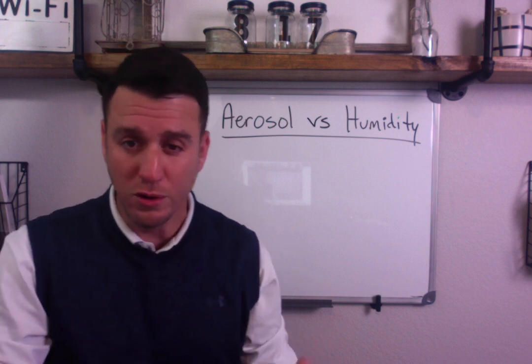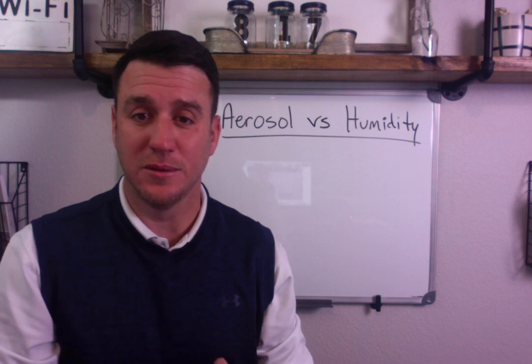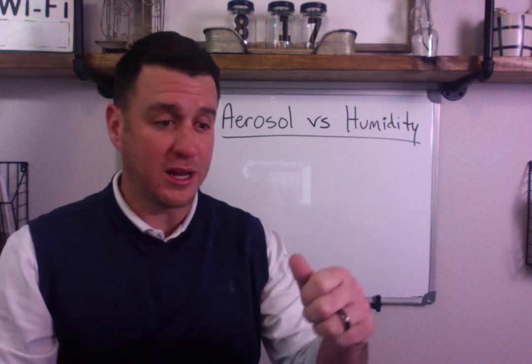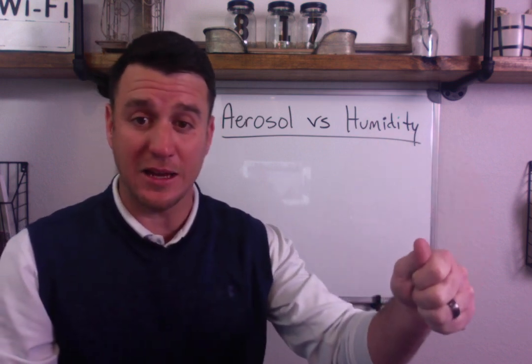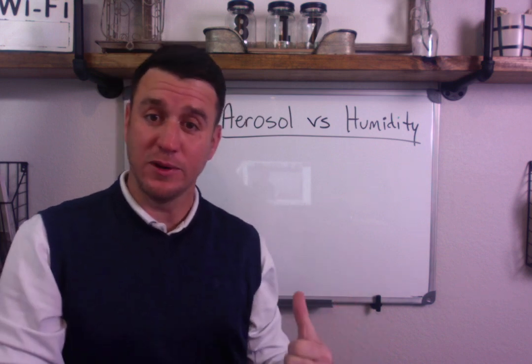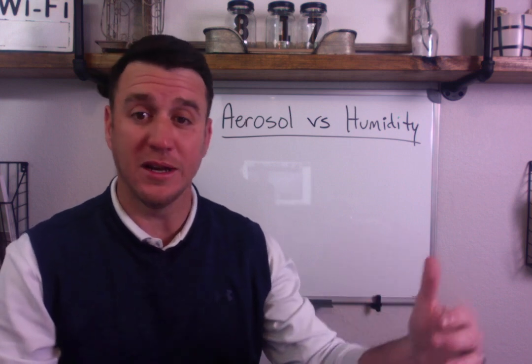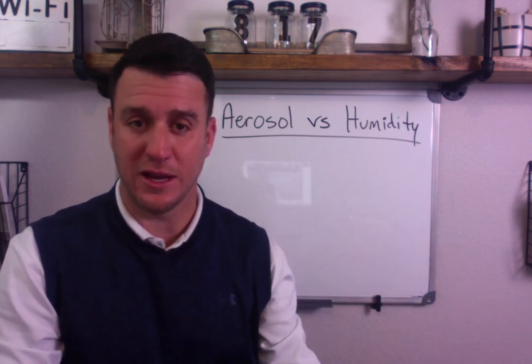Now, some of the newer aerosol devices, it's really hard to see the mist, but just take it, put it against a dark surface, maybe put it in the light. If you can see the aerosol, then that's what you're dealing with. You're dealing with an aerosol device, not a humidifier or a humidity-based device. Okay, so that's the first thing.